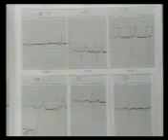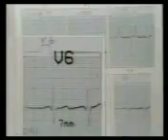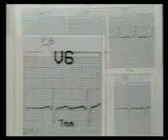This ECG shows a prominent R wave in V1 and a deep S wave in V6, that is a change in the QRS pattern. RV1 is 9 millimeters, more than 7 millimeters, and SV6 is 7 millimeters. So RV1 plus SV6 is 16 millimeters, that is more than 10 millimeters. So right ventricular hypertrophy is present.